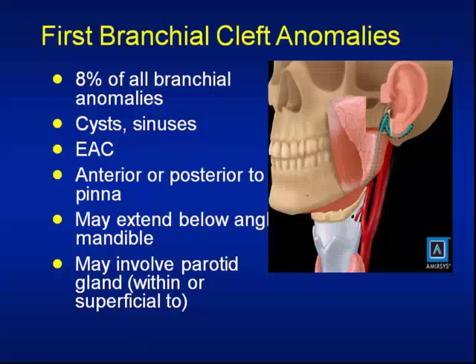Also, they can extend down to the angle of the mandible. And so if you see something at the angle of the mandible, try really hard to trace it backwards or craniad to see if there's any connection with the external auditory canal, because the clinician's going to need to know that.